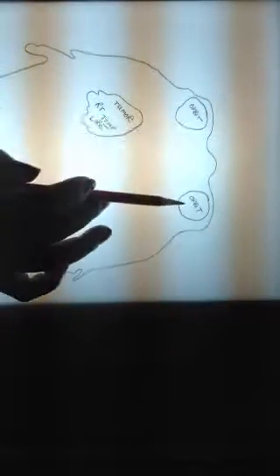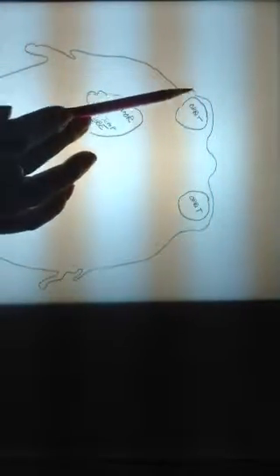So I'd like to demonstrate how to do isodose correction for missing tissue, air gaps, or extra tissue. This will be a demonstration of the assignment you're supposed to complete regarding the 2/3 shift. I'm going to start with the contour that I've taken, and I want you to do your 2/3 shift assignment on the contour that you took of your patient. It's not necessary for you to draw internal contour structures, just to have the external contour drawn.